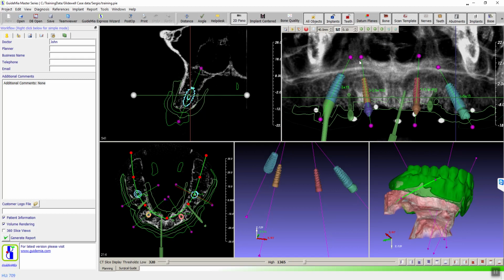So that's pretty much the full arch workflow and all the functions. We have gone through almost all the little tiny details, and for regular production, we probably will not need so many functions there. So I guess we can have another demo video to show the core functions instead of everything as we did today. Because Brian is very experienced, so I had to show everything.